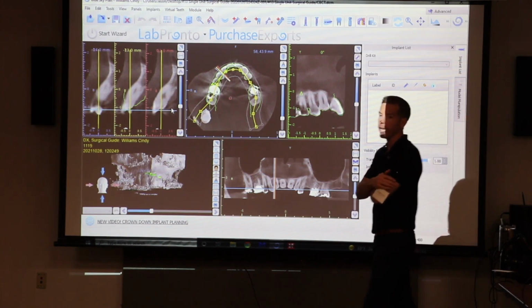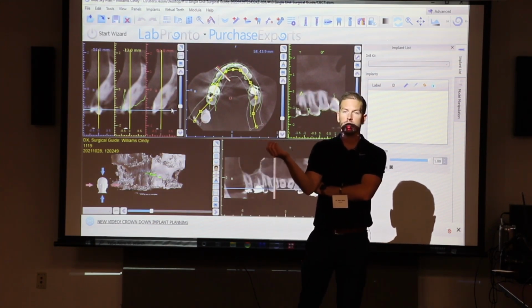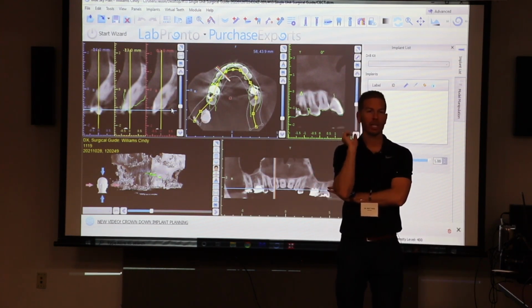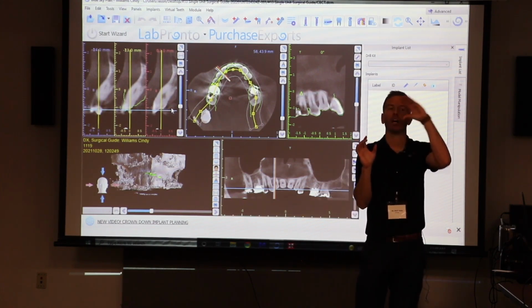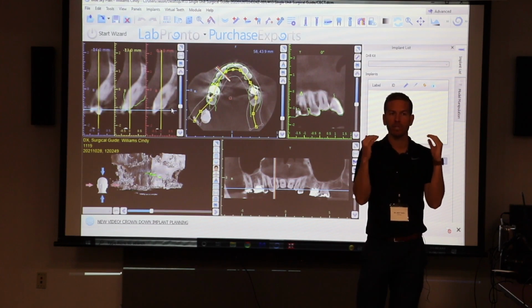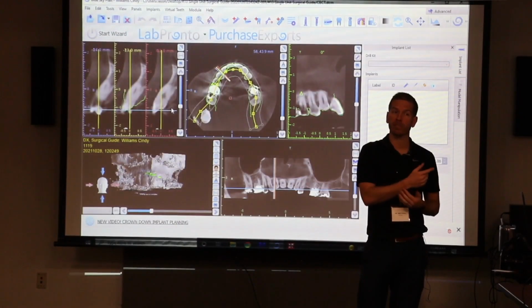So I would say the more scan data from the STL that you have, the more accurate the alignment might possibly be. So let's just say you scanned a quadrant and you want to align it. It's only going to have maybe 4 teeth to really align, which might be totally fine. But when you get cross-arch alignment, you're going to get a much more accurate stitching of what's really happening in real life. So more data, I think, is going to be better for stitching.